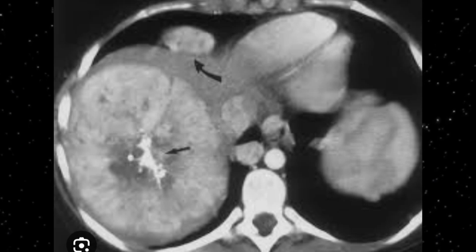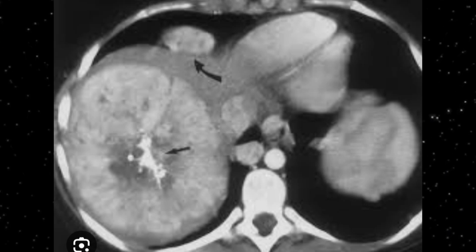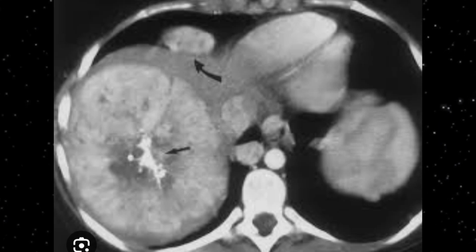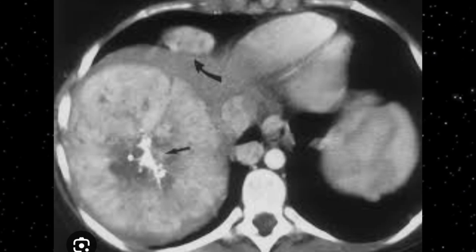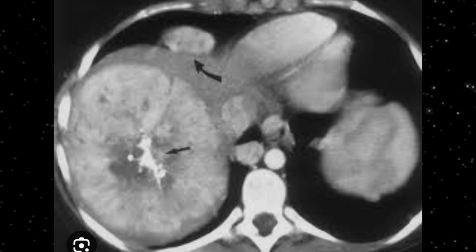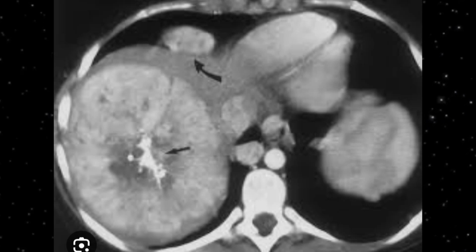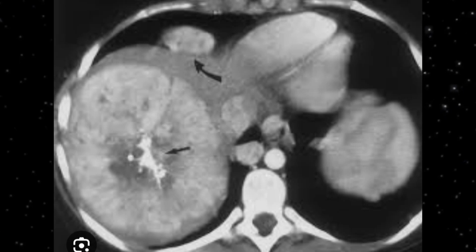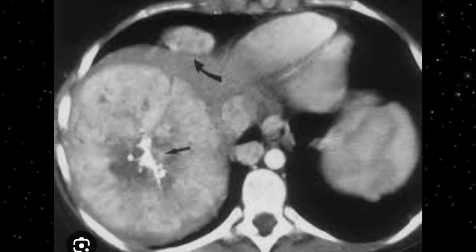So far as the central scarring is concerned, you can appreciate central scarring with high uptake of contrast because of central vascularity, and this is why this lesion is known to be a bit difficult, because of the fact that it has a life-threatening risk. The life-threatening hemorrhage risk is because of this vasculature. Here you can appreciate that contrast has been picked up by this central vascularity, and this is hepatic adenoma.